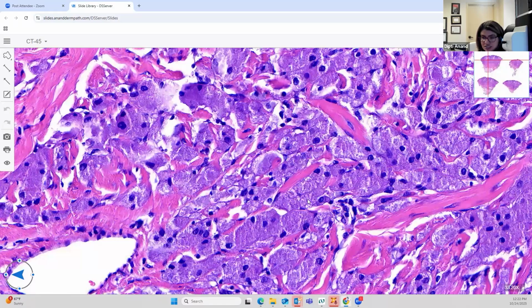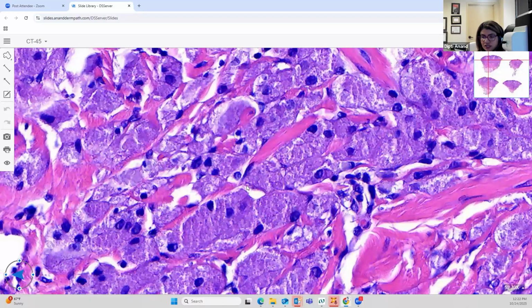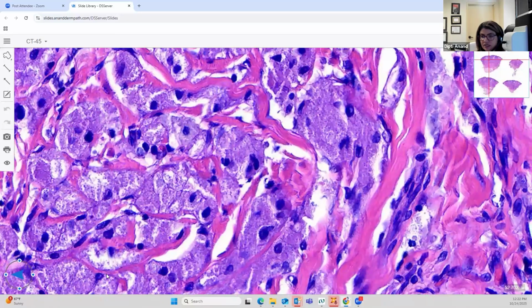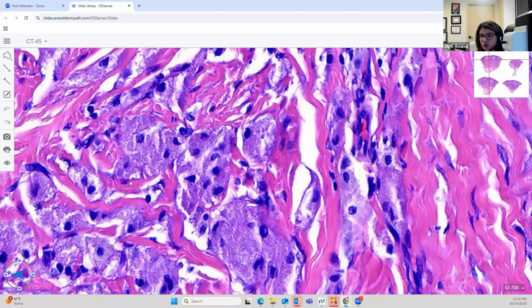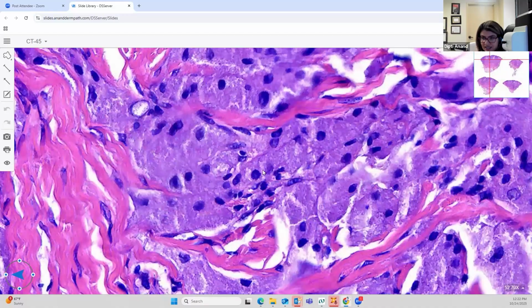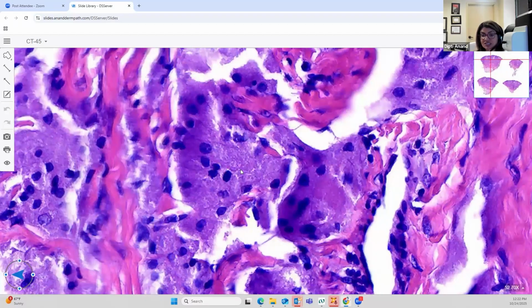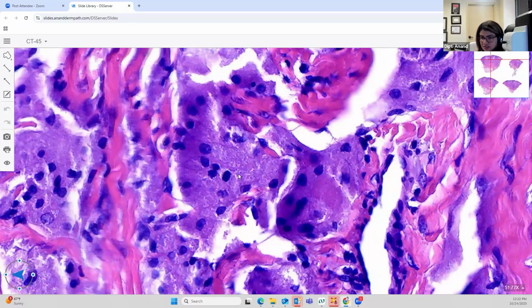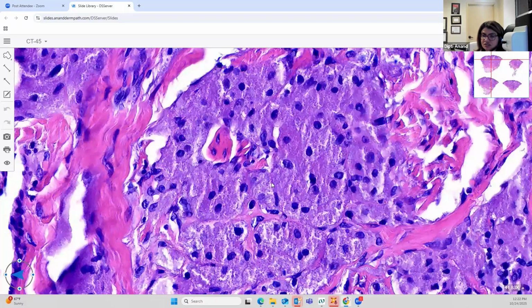You see these large cells, which are almost histiocytic cells, but they're not histiocytic cells because they are Schwannian cells, which have this eosinophilic granular cytoplasm. And then we are looking for those nice perinuclear pink inclusions, which are right here, which are your pustulo-ovoid bodies of Milian. So each of these eosinophilic granules is a lysosome stuffing up these histiocyte-like cells, which are actually Schwannian cells. So they are S100 positive, and these lysosomes are stained with CD68.